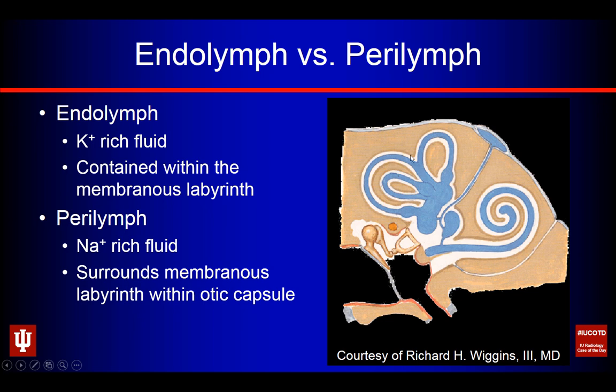So we have all these bony structures that form all of these canals and chambers. Contained within it are all these sacs that contained the endolymph, and surrounding that endolymph is another sac-like chamber that contains perilymph with sodium-rich fluid. And that perilymph is continuous out to the subarachnoid space via this cochlear aqueduct. And we see that pretty nicely on the heavily T2 weighted images.